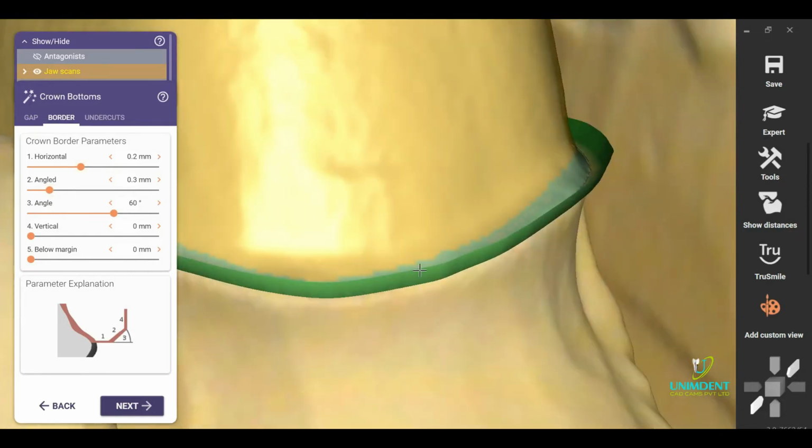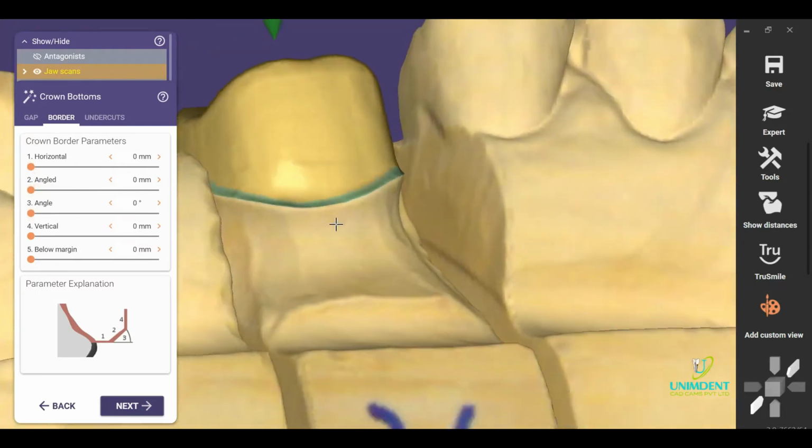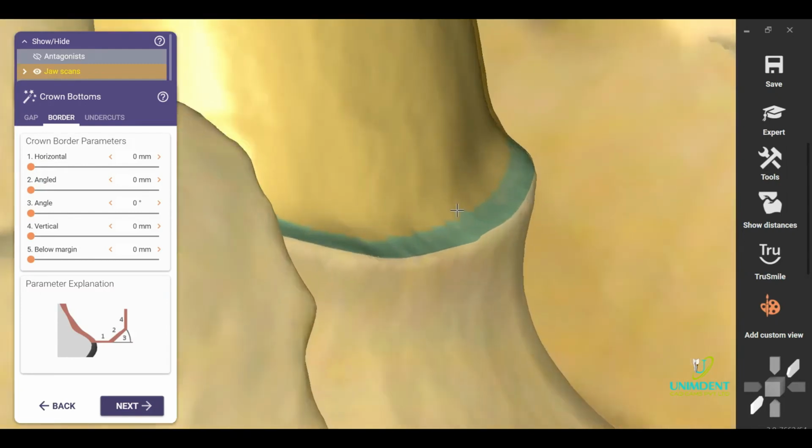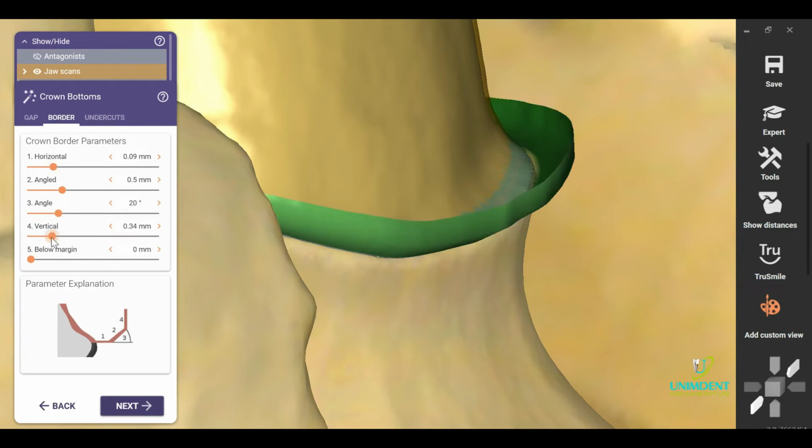look at this point now. What happened when I pushed to 0? It now put the position in a fixed way, so the margin will be adapted correctly to the finish line. But here there is a difference. We look at them.